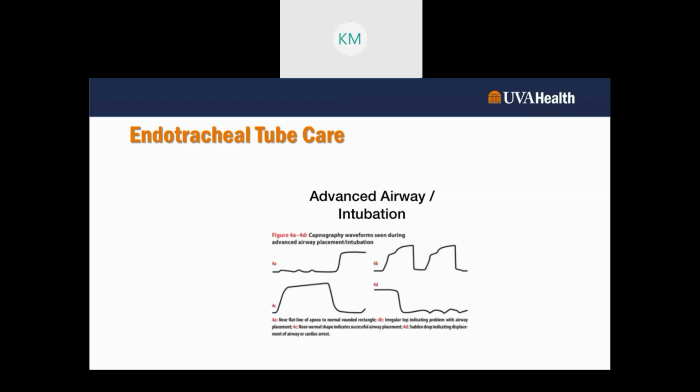4C is a near normal shape, indicating successful airway placement. That makes me happy. It brings me joy. It's what it's supposed to look like once we've placed our airway. I have my happy little boxy waveform with that slight increase on that alveolar plateau there. Being mindful that if my physician misplaced my ET tube, there's going to be no alveolar plateau at all.